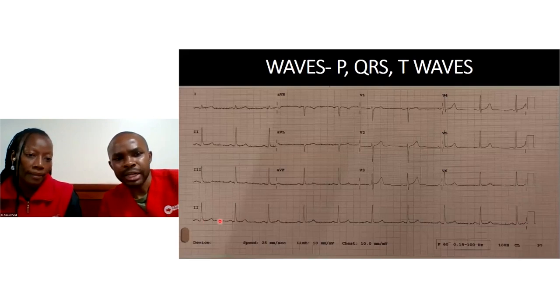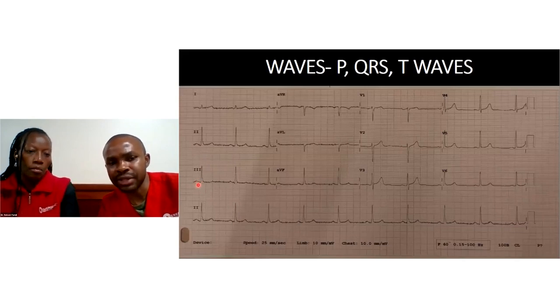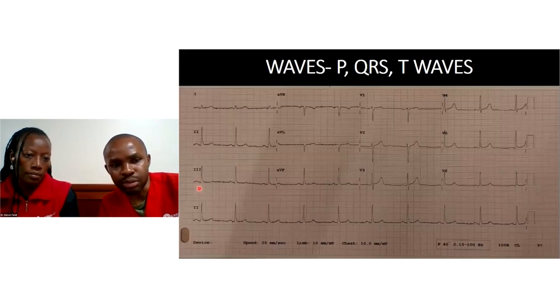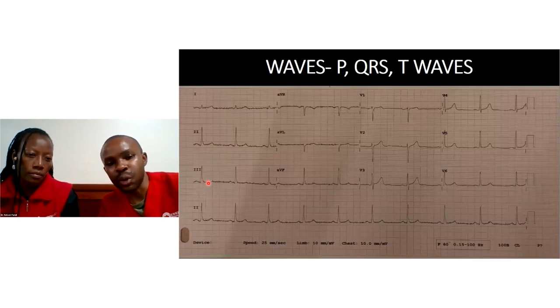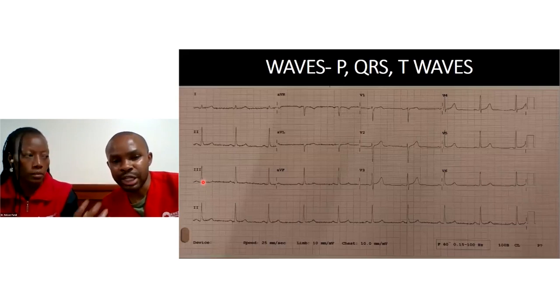All right, so remember we talked about the QRS complex. The Q is the first downward deflection after the P wave. For example, here, this small deflection you're seeing might constitute a Q wave. And then afterwards, the upward deflection, that's the R wave. And then the downward deflection after that is the S wave. So that gives us the Q down, R up, S wave complex, and it represents the ventricular depolarization.